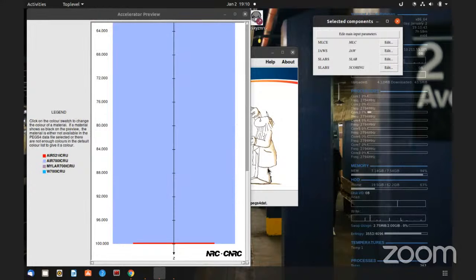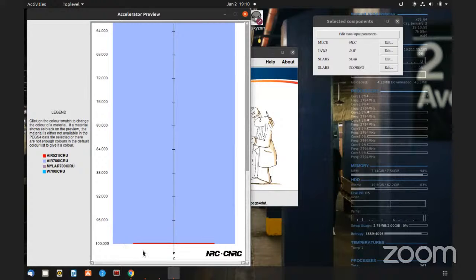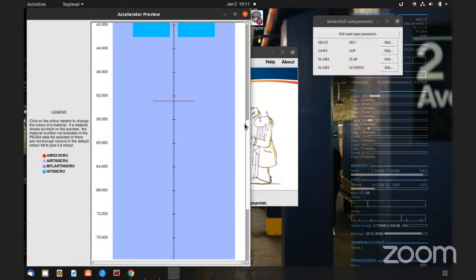So these are just my two comments. One last thing: sometimes, at the beginning when you're tweaking or checking your model, that's fine. Usually, all of your work you will be doing at 100 SSD, so you're getting a phase-space file at 100 SSD. But after you do that, maybe it's better that you actually get a phase-space file, let's say at 55 centimeters here.